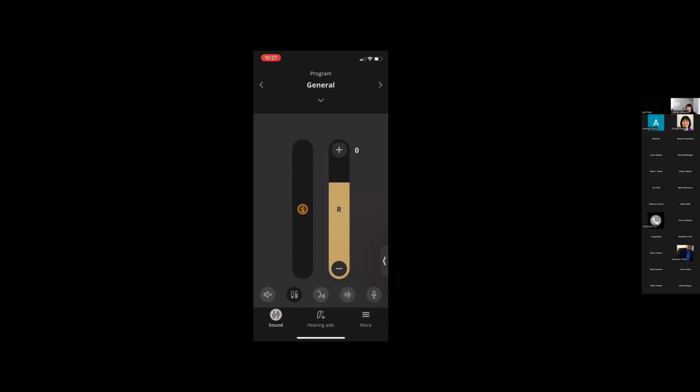That takes fooling around with, but remember, that function is only for streaming music from your phone or another relay to your hearing aids. It does not work for when you are accessing information from your hearing aids and using them in active listening mode. So it's important to remember that you can't change how your hearing aids are live listening because they are set to a certain prescription, meaning the prescription that you got from your last hearing test.